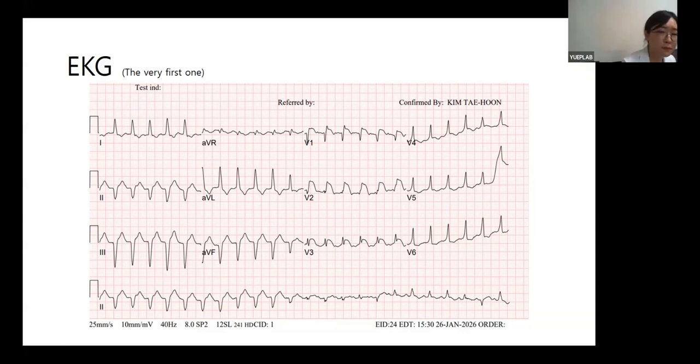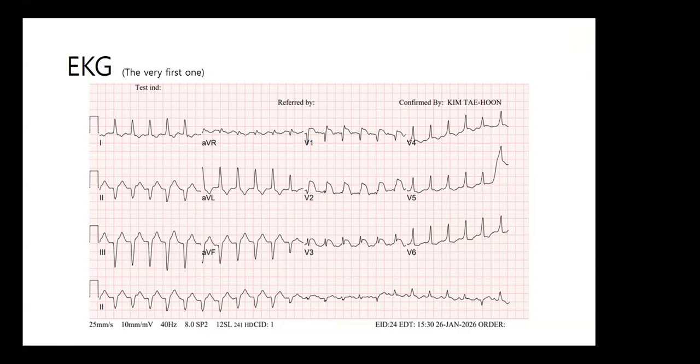I think, if you look carefully, there is ST-segment elevation also in leads 2, 3 and aVF, except that there is a predominant QS wave there. I think probably it is because the precordial leads are close to the chest, unipolar. I think that's what manifests the way it is. So maybe it has to do with the unipolar nature of the precordial leads, which shows it more accentuated.